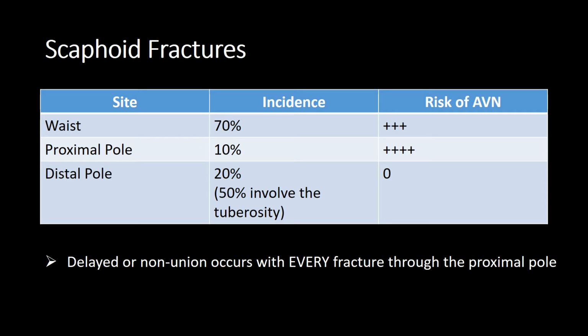Frequently, when you get a scaphoid fracture, within a couple of weeks you get so much resorption of the fracture site that it will look quite cystic, i.e. quite a lytic appearance. You also get an increase in density to the proximal fragment, and there are two reasons for this. The first is rarefaction of the surrounding bones and the distal fragment, basically because there's a really good blood supply. So essentially the bone is undergoing a lot of resorption.